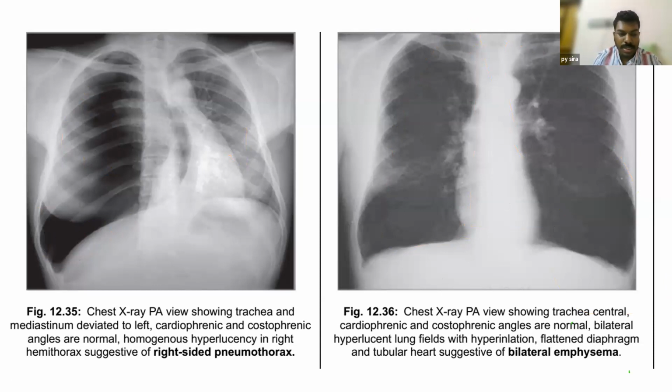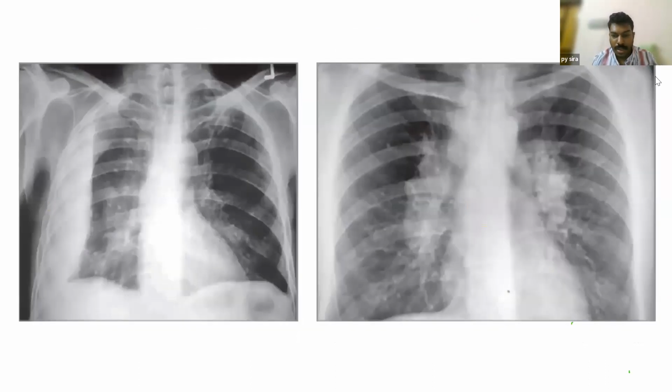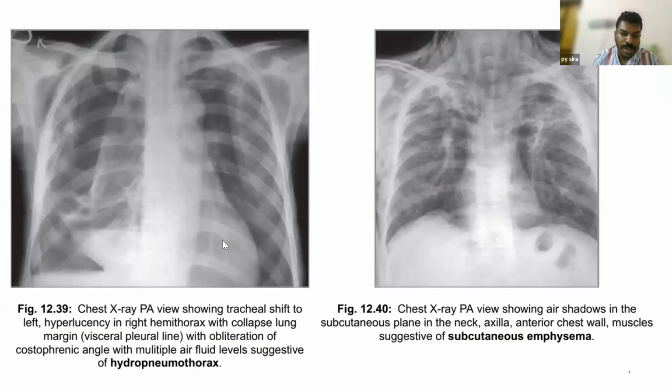Okay, next is this one. Again, you can see the paratracheal lymph nodes, pretracheal lymph nodes getting enlarged. Usually it can be sarcoidosis or tuberculosis or lymphoma. And what you get to see here, again, is pleural effusion, which is seen over one side of the lung.